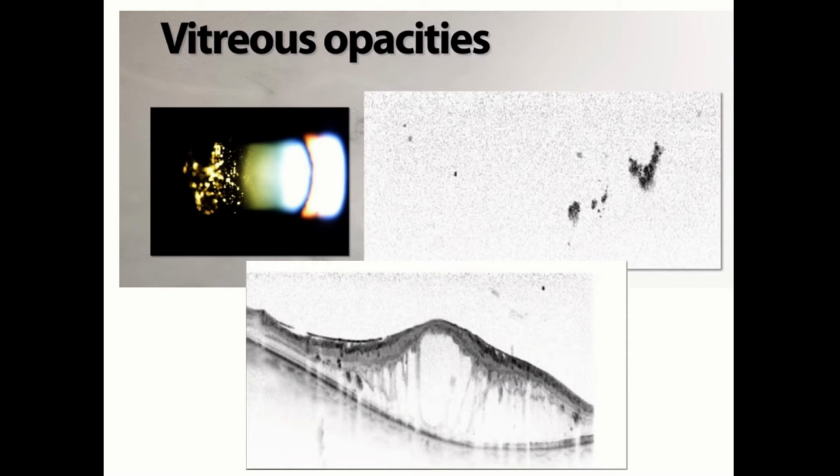This is a patient in which you can see there's foveal elevation in the center, and then the retinal layers are not present on the inner side, and there are strands which are going towards the retinal pigment epithelium, sort of identifying this patient to be of retinoschisis.